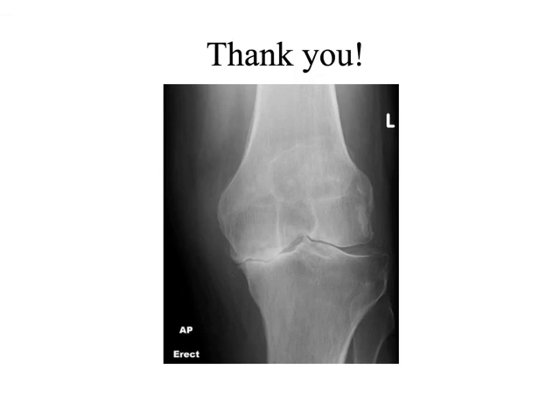What are we talking about here? What are we looking at? AP knee, appropriately marked. It says it's erect. Why is that important to this image? Standing. So what might we be trying to evaluate on this image? Is it closing? So what might be causing this joint to close like this? Osteoarthritis. This is some serious bone-on-bone arthritis here. We can see it particularly on that medial aspect of the epicondyle. It's just all sorts of torn up. Okay?